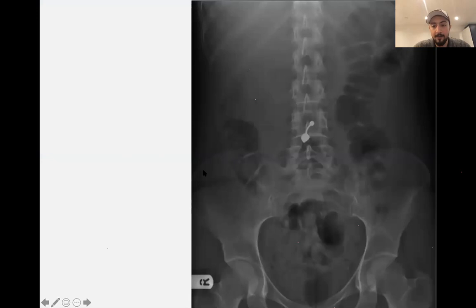Okay. So we've moved on from the first B, which is bowels, second B, which is bones, and then the third, which is C, which is calcification or artifacts. We've seen some calcification like kidney stones, staghorn. You can also find some stones in the gallbladder on the right upper side of the abdomen.